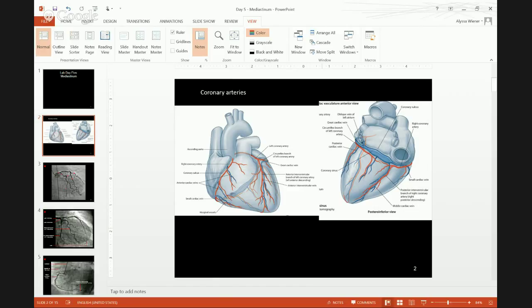It's asking for the aortic arch. I don't think you can really see it on here. You just kind of have to imagine it. But the aorta is coming off pretty much at the middle of the heart. And then it's going to arch around to the patient's left. Right.